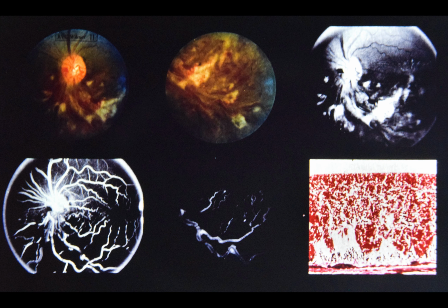Upper left and upper center note extensive hemorrhages and cotton wool spots in distribution of inferior papillary branch vein. Venules are engorged. Upper right, photograph taken in red-free light, shows stellate pattern of hemorrhage, lipid, and edema in macula. Lower left, 15 seconds after dye injection, note collateral vessels shunting blood from inferior retina to superior retina on both nasal and temporal sides of fovea.